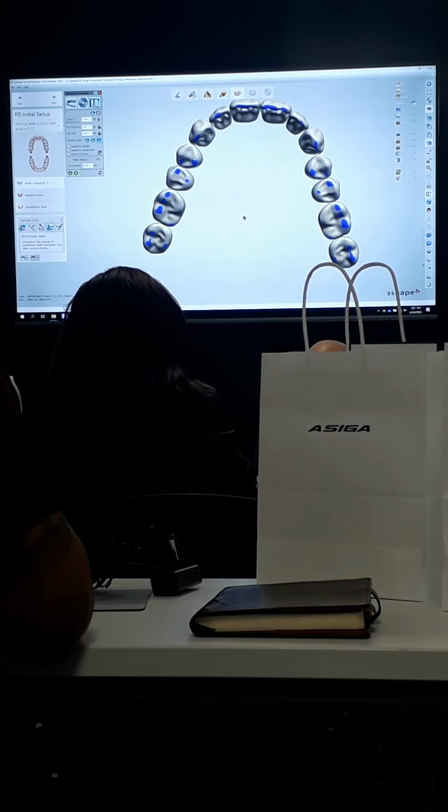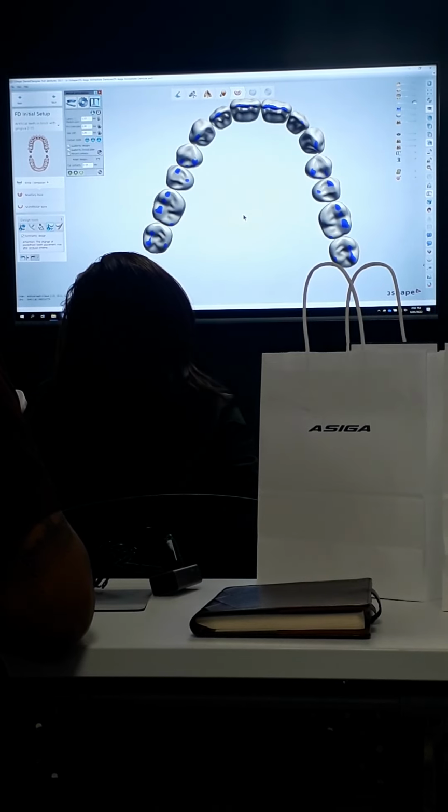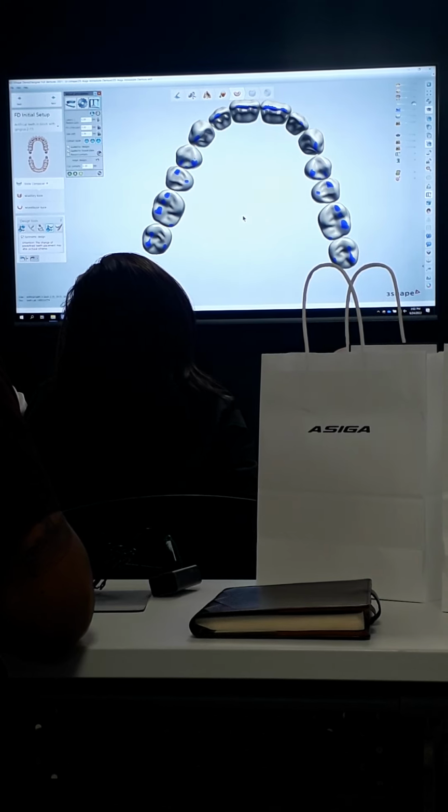The feature on the articulators is generic to all of them, like the incisal pin. It's meant to match the physical articulator. For instance, for our lab scanner we offer what are called transfer plates. You take whatever articulator you're using, as long as it matches one of the ones in our software.